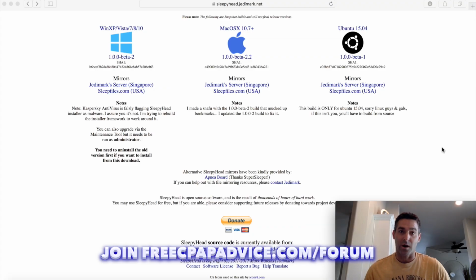All right, so here we are at sleepyhead.jedimark.net. Whatever operating system you have is what you want to do. Now, I'm doing this video because I just got a Mac. And now it needs to be a Mac operating system 10.7 or greater. Now, I'm not trying to brag or anything, but I just bought a used Mac and it's actually 10.12.